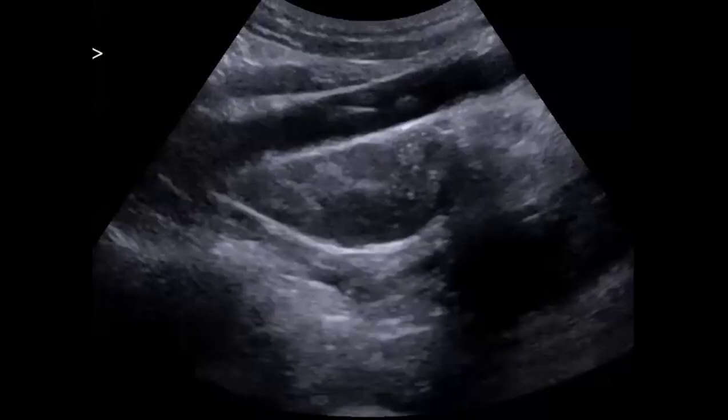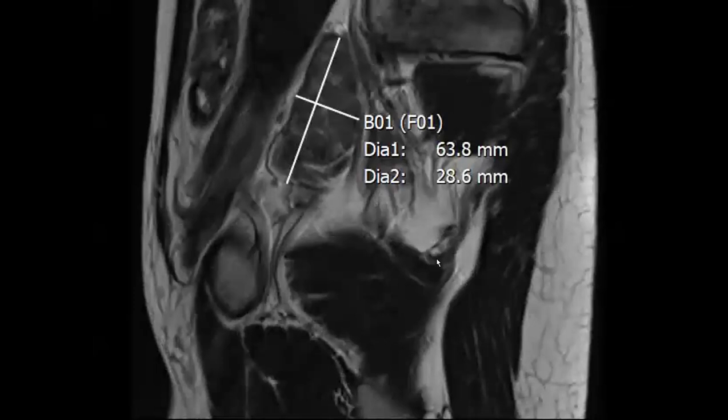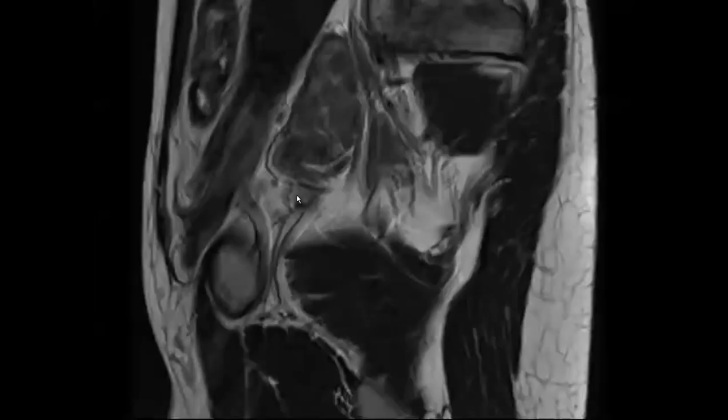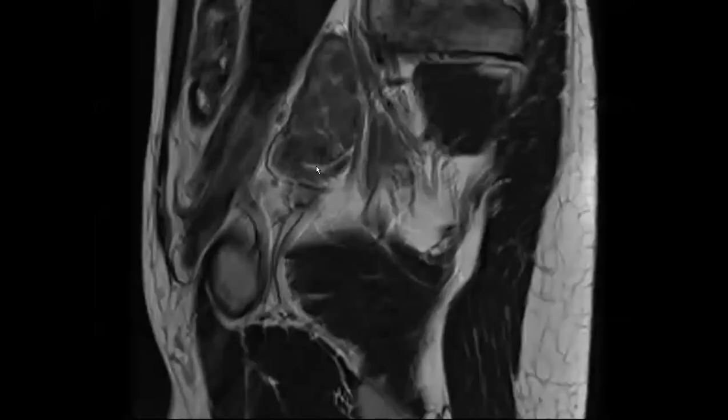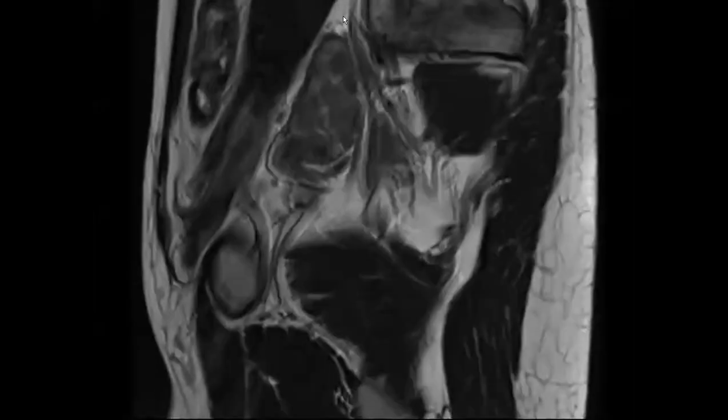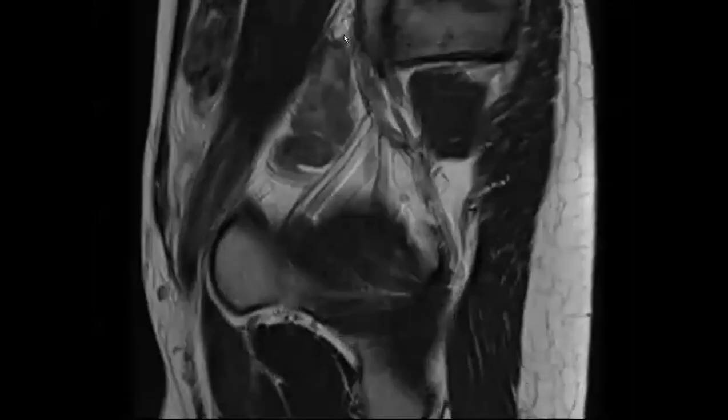Could it also be adrenal rest? That's again a very good thought. So MR is done, and you can see bilateral, multifocal lesions. Let me show you sagittal. These are actually Sertoli cell adenomas, which are T2 hypointense and characteristic of undescended testes in complete androgen insensitivity syndrome. Additional findings can also include paratesticular cysts.